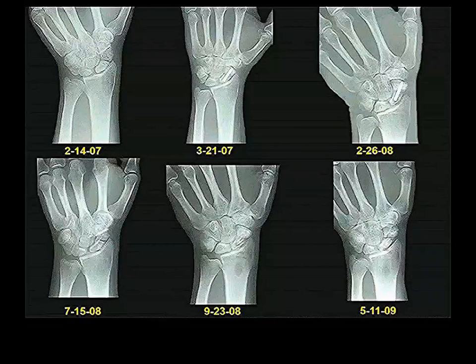So this was done in February, and they decided, boy, we want this to heal, and it's going to be best if we can bring these two fragments close together. Maybe the blood supply hasn't been completely interrupted, or we can promote the blood supply going from the distal fragment to the proximal fragment. So they put a pin in it and pinned the two fragments together.